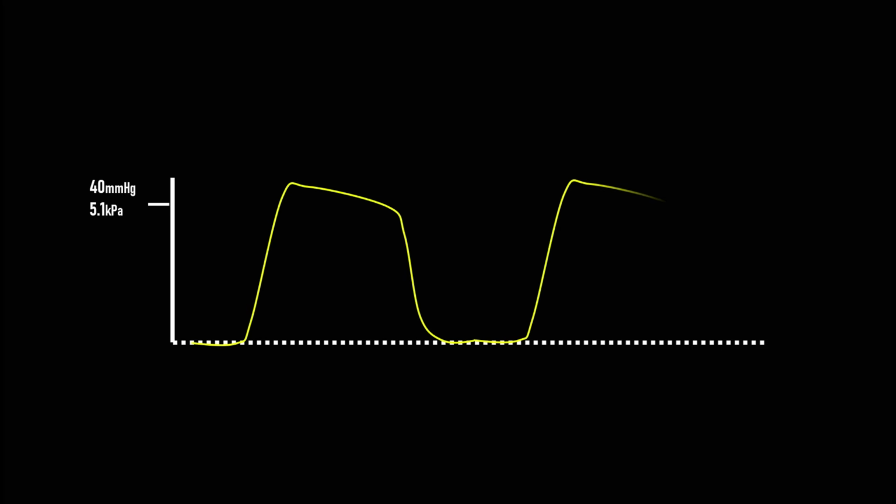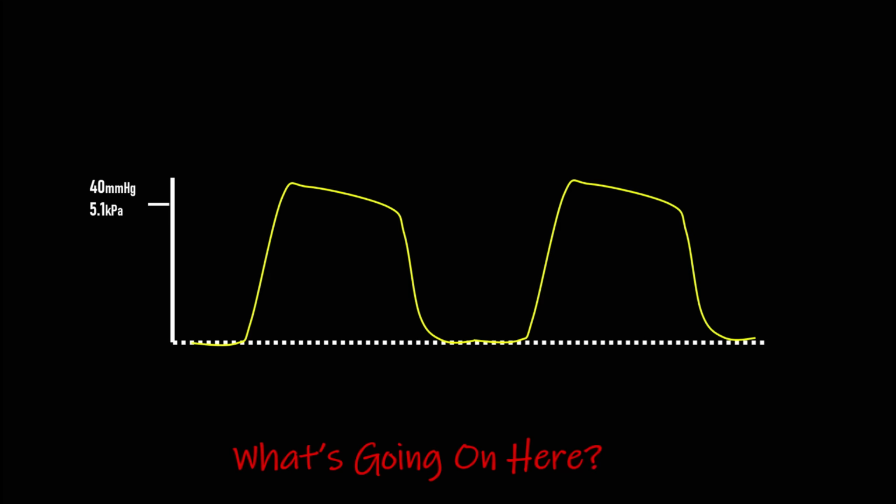This is a very unusual waveform. What do you think is going on? It's very strange because there is a very rapid upstroke in the CO2 trace and then it falls down a bit before it falls off a cliff. And this is a picture that you occasionally see in emphysema, and it is almost the opposite of what you see in bronchial obstruction.